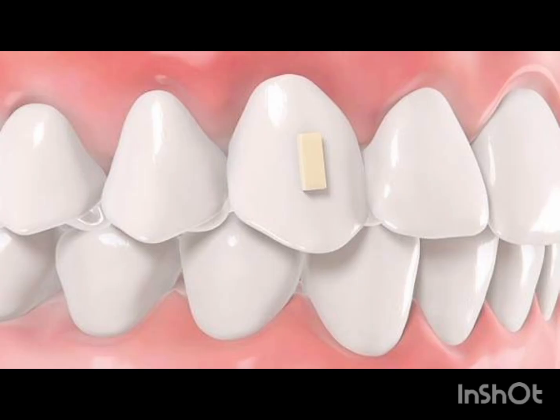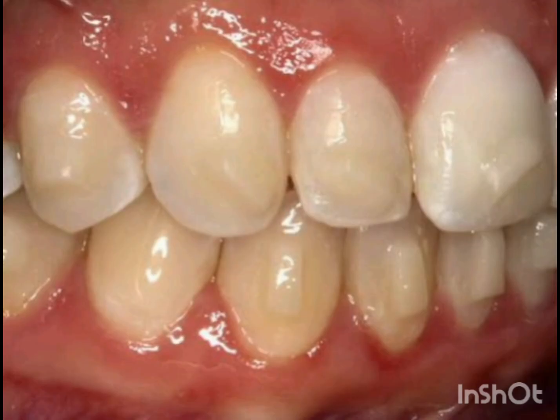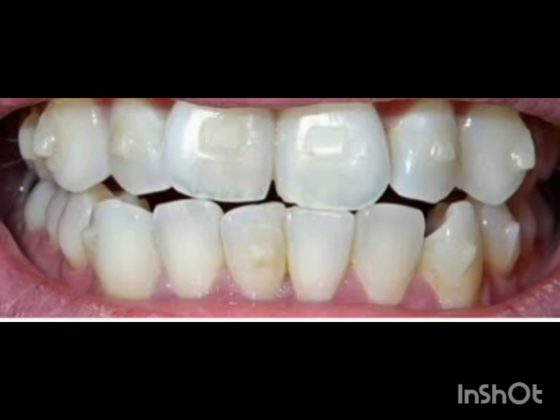Some mistakes do occur when we are reviewing the digital setup. So, what are these mistakes? Let us see. Incomplete diagnosis, ignoring periodontal health, excessive expansion, unrealistic tooth movement, incorrect attachment placement, excessive IPR, ignoring posterior occlusion, approving the setup without reviewing every stage, depending entirely on software recommendation. The software provides suggestions, but the orthodontist makes the final clinical decisions.